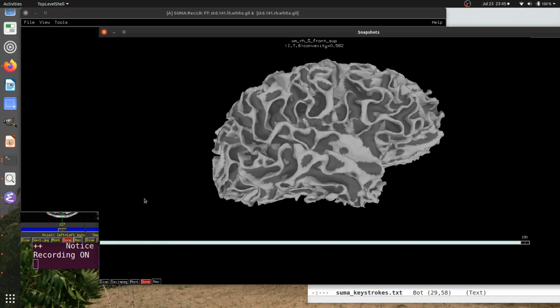I still have not saved my actual video yet. I've just chosen the format. I'm going to left click on this button, and now I'm going to type something, movie. And again, similar to the AFNI video recording, I can go from the 0th image to 190, this maximum, or I could take a subset.